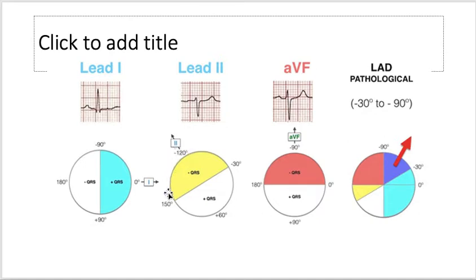So if we take that negative half of the circle, because we don't know exactly which direction it's going, we just know it's on average going in the negative direction, we take that yellow half and remember that yellow half again. So we have lead 1 and lead 2.